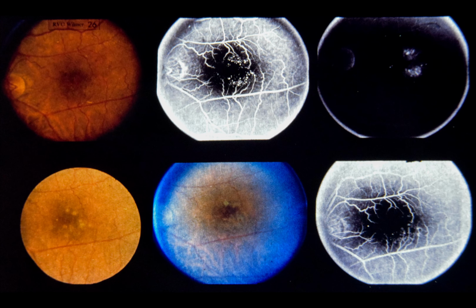This 60-year-old white female with a 9-year history of diabetes recently noted metamorphopsia left eye. Visual acuity was 20/40. Upper left, note microaneurysms and lipid in fovea. Upper center, microaneurysms fluoresce 21 seconds after dye injection. Parafoveal capillary rim is intact and there are no major areas of capillary closure. Upper right, 20 minutes after dye injection, cystoid maculopathy is apparent.